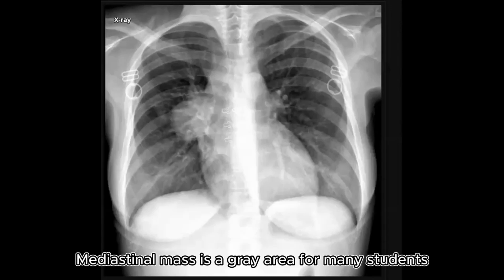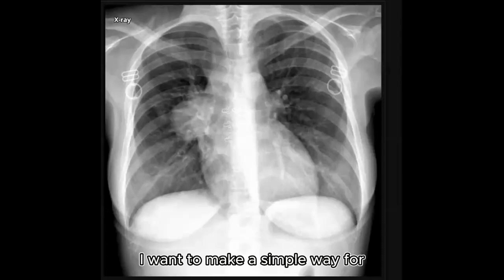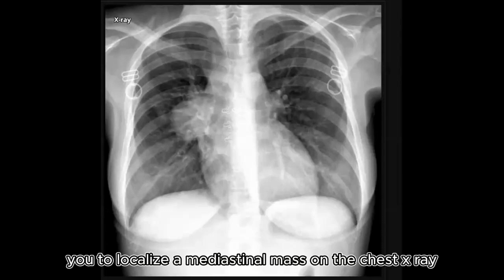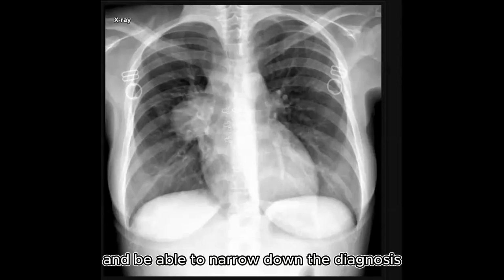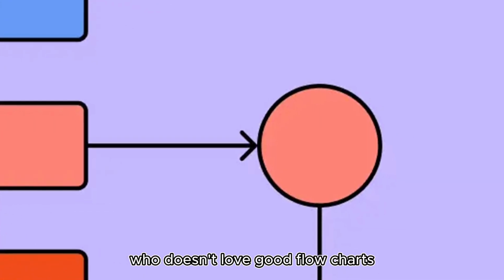Mediastinal mass is a gray area for many students, literally. However, I want to make a simple way for you to localize a mediastinal mass on a chest X-ray and be able to narrow down the diagnosis. We will use a flowchart to simplify the steps, because let's face it, who doesn't love a good flowchart?